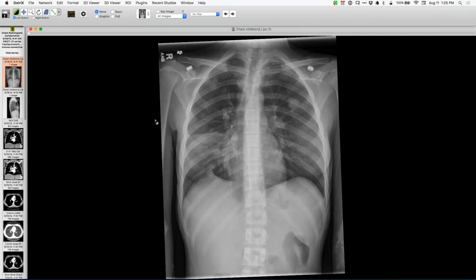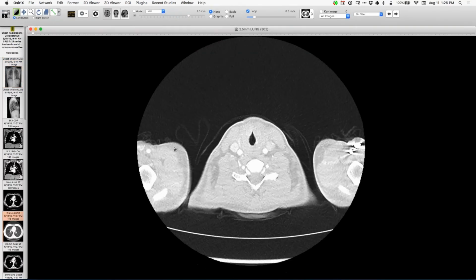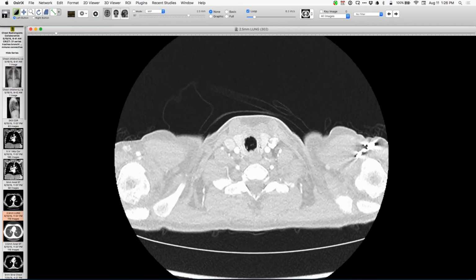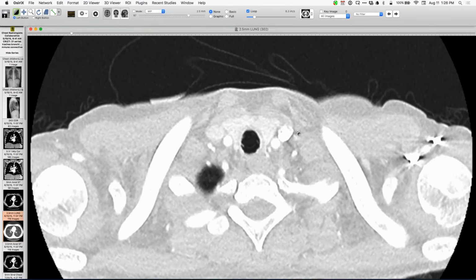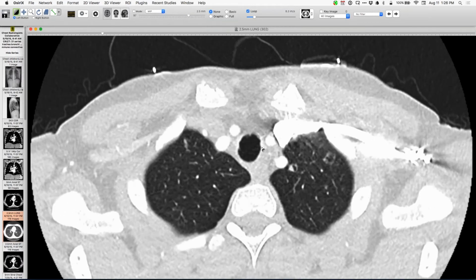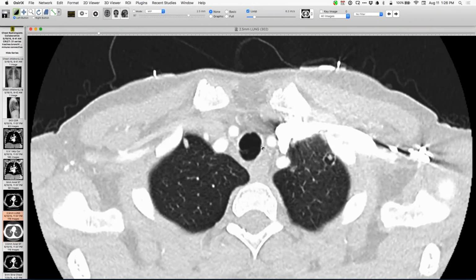Here I have a case, in a young person, really unfortunate, of severe GPA. On the chest radiograph, you can see multiple bilateral parenchymal opacities of different sizes, certainly consistent with that. I will bring in the images of the airway, but just look how severely the airway is affected here, not so much with mural thickening, but what appears to be a tremendous mucosal, ulcerative, sloughing process involving the trachea, and of course we'll see some lung findings pretty typical of GPA as well.